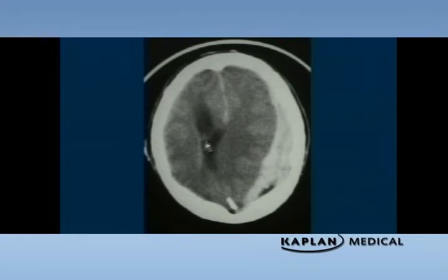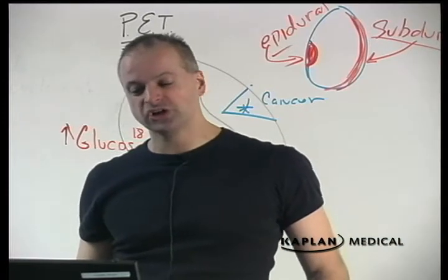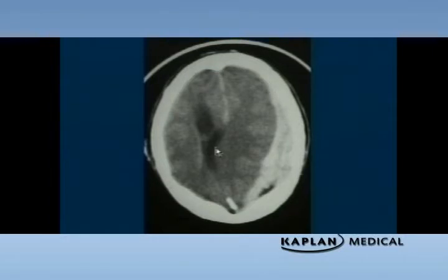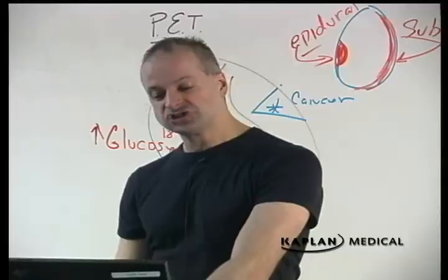Intubation, hyperventilation, and evacuation as soon as you can drill a hole through my head. This is a person who's taken this structure, which should be over here, and has herniated it over. If they're not drained now, they will be dead or permanently brain damaged. Subdurals conform to the shape of the brain. That doesn't mean it's always benign.